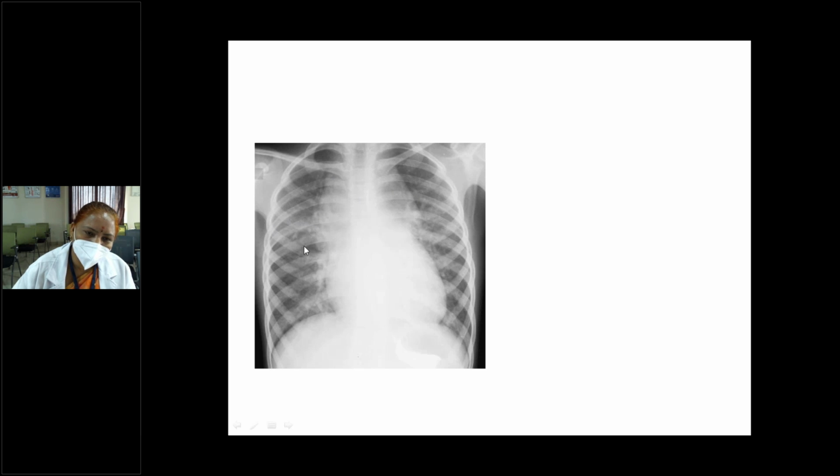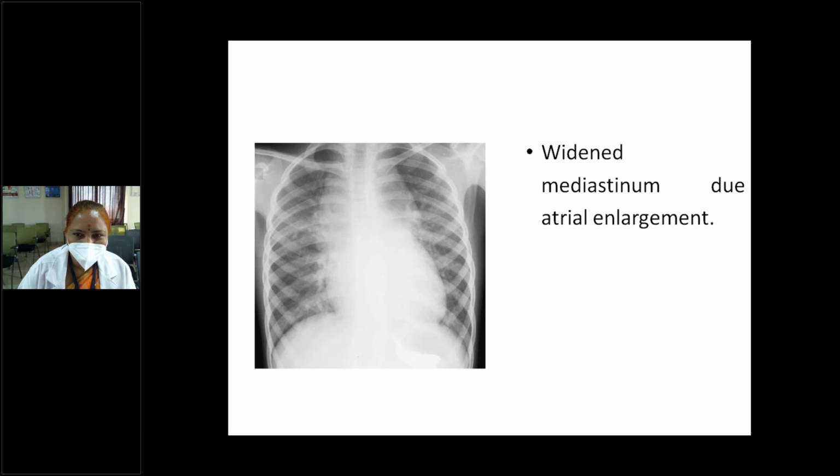There is pulmonary plethora. It looks like a number, like an 8.